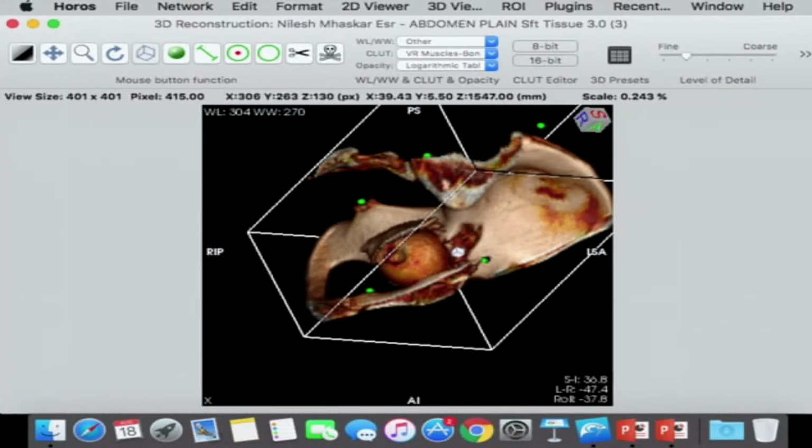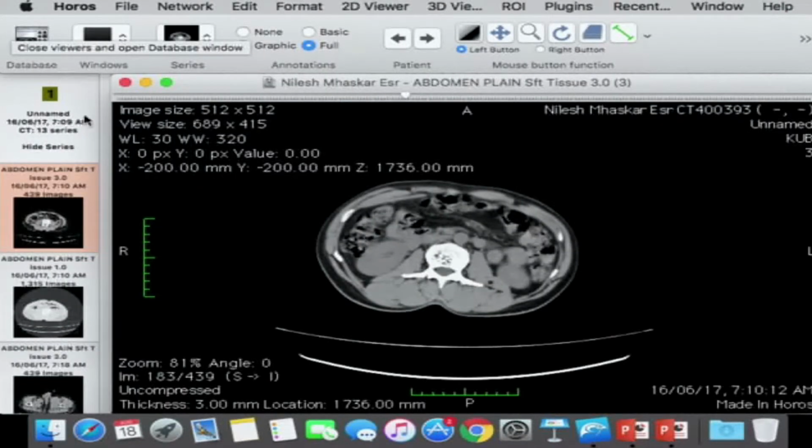So this is a very important tool in cases of impacted fragment, how to approach that impacted fragment. Sometimes it is possible to assess it through the fracture site. Many of the times I am not able to assess it through the fracture site. I need to make a bone window to disimpact that fragment. Where to make that bone window can be very well seen on this 3D model. Now there are multiple implications of this also.